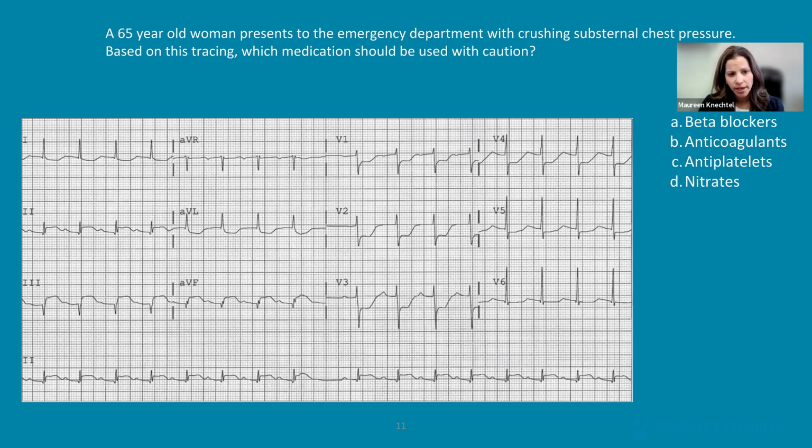So if we're affecting the right coronary artery, here's where the interesting part comes in. What you want to be able to pick up on this EKG is, in addition, we've got what looks like ST segment depression in V1, V2, V3, and really it extends all the way over into V4. So we typically think about V1 through V4 as telling us about the anterior leads. But in the setting of an inferior STEMI, you should always look at those leads to tell you about the extent of the myocardial involvement. And this is actually showing us posterior wall involvement.